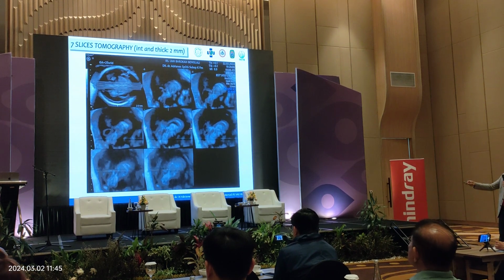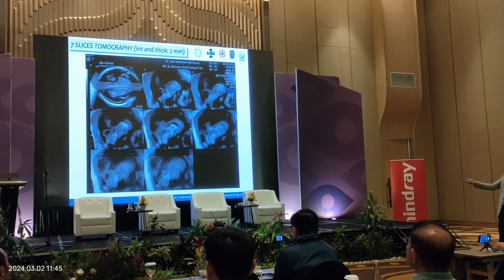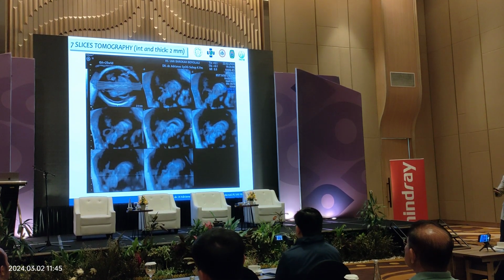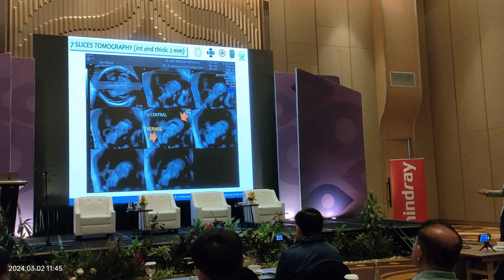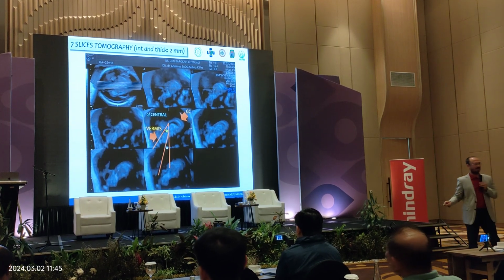So you see the center point representing the middle slice, and the others representing the left and the right side of the brain, if you are slicing sagittally on the axial plane. So this one is clear. Okay, this one is corpus callosum, and this one is vermis, and you can measure the angle.